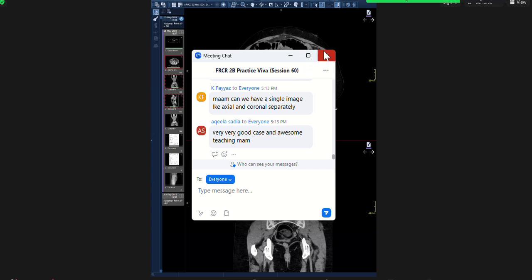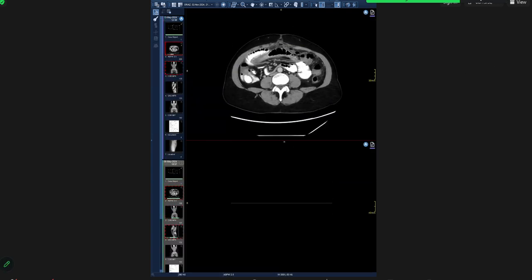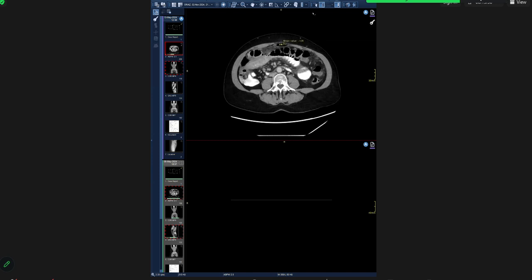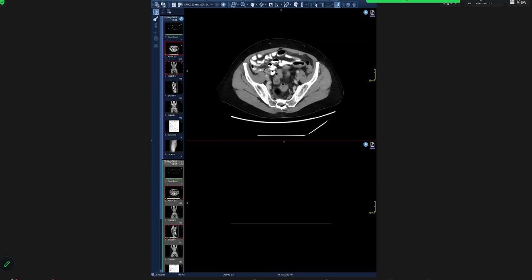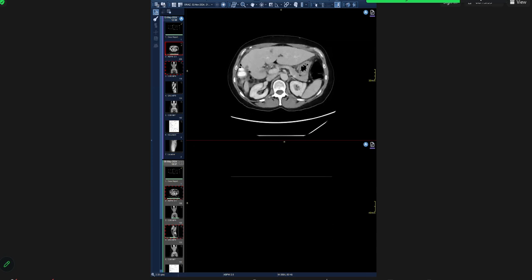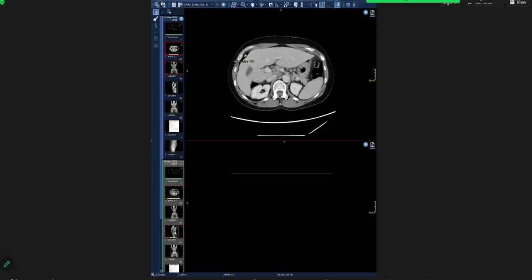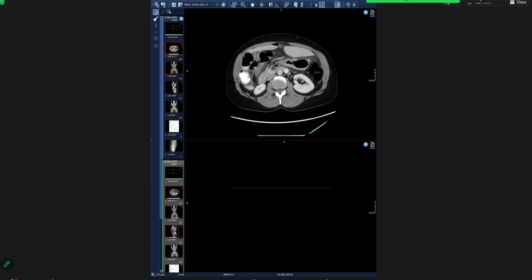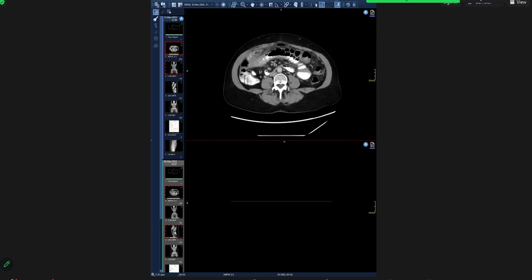So this is this, and then this patient here, I didn't show you this one because here the patient had really worsened. Yeah, here you can see it even here. So there's been redistribution here and there is this fat everywhere. See that?